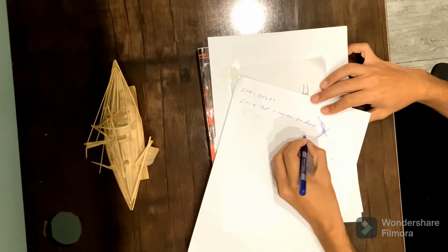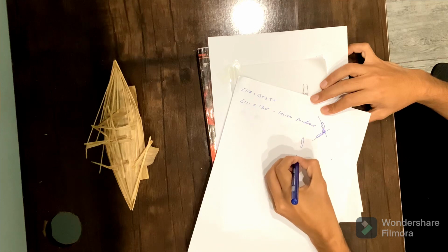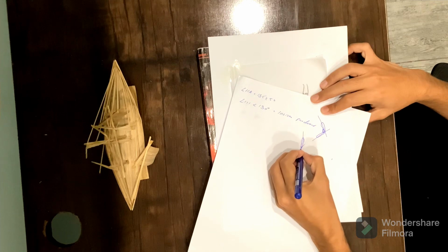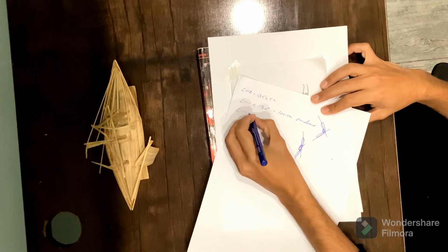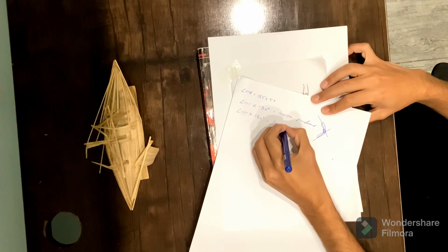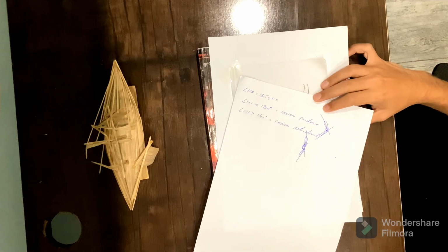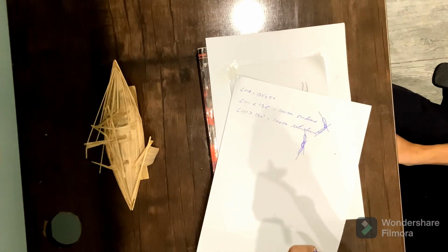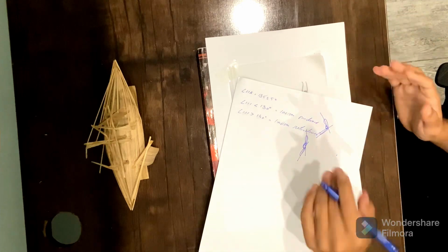If the incisors are retroclined, if these are more in upright position, the angle will become larger. As a result, the interincisal angle will be greater than 140 degrees, which tells us the incisors are retroclined. So this angle is very important in telling us whether the incisors are proclined or retroclined.